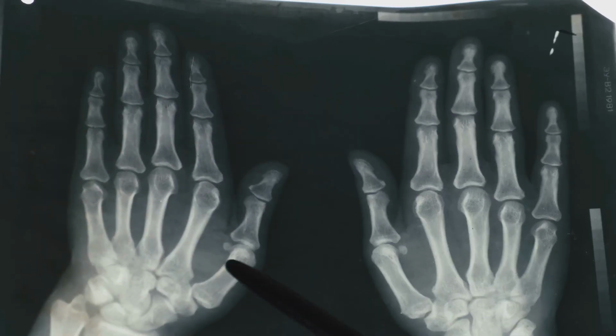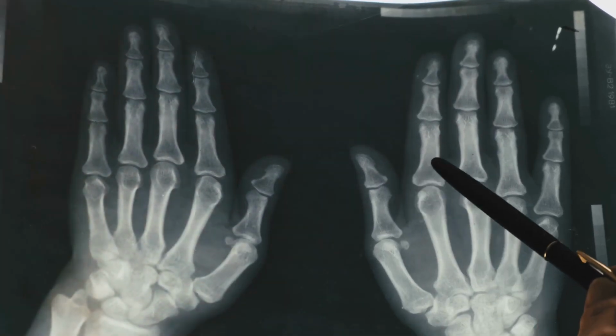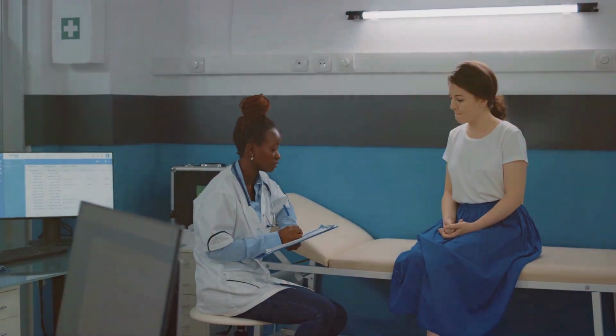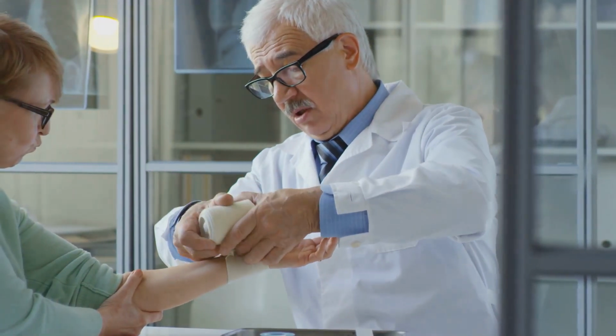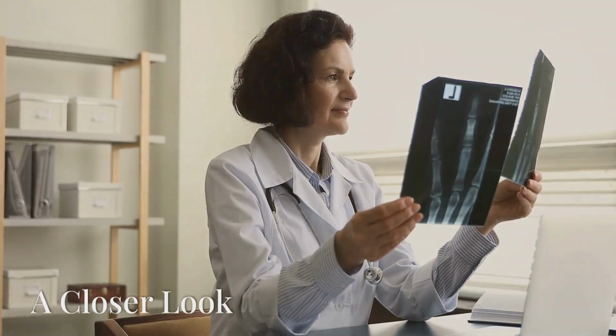It helps you diagnose fractures, dislocations, and other problems. This means you can start the right treatment plan sooner. So, put on your imaginary X-ray vision goggles and let's get started.